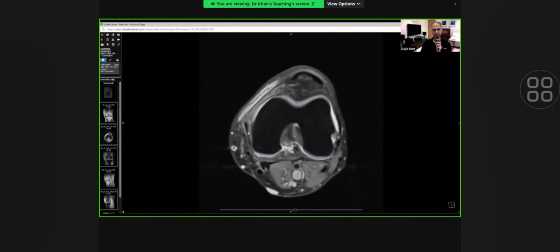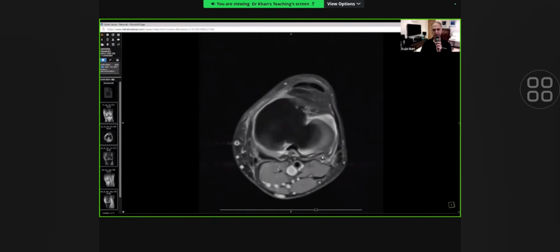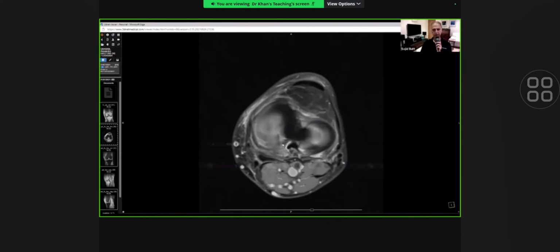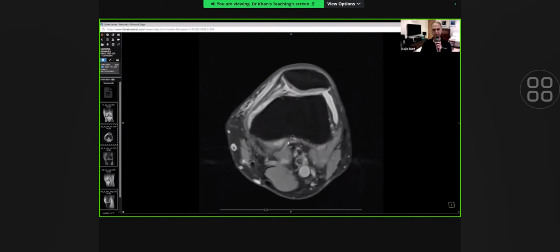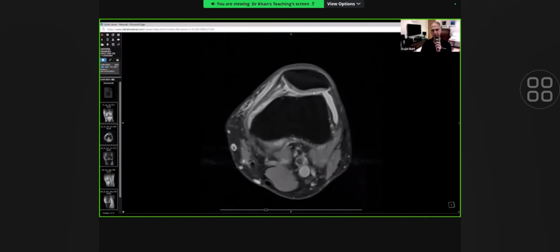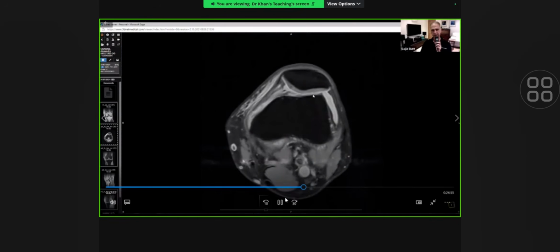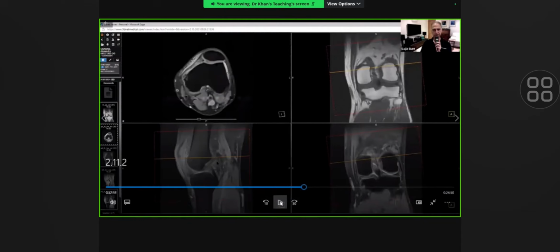That was the sprain of the MCL. We've got the tear of the posterior root attachment of the medial meniscus. And in the axial imaging, we also see cartilage irregularity on the lateral patellar facet, chondromalacia. And the trochlea is a little bit dysplastic.